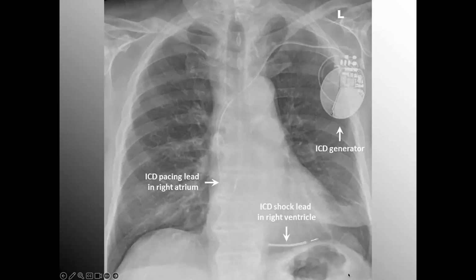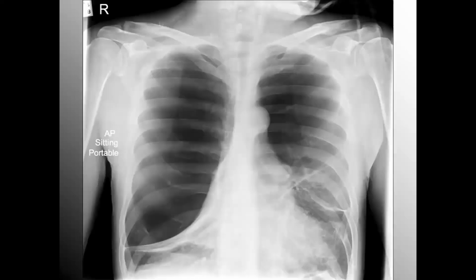So once again, we've got just a typical X-ray where you have multiple different densities, a lot of which are not necessarily vascular, but just what we call prominent interstitial markings. You see this a lot with fluid overloaded patients. Obviously, this patient's got a history of cardiovascular disease if they have an ICD with an implantable shock lead there. So this is not something you see every day.